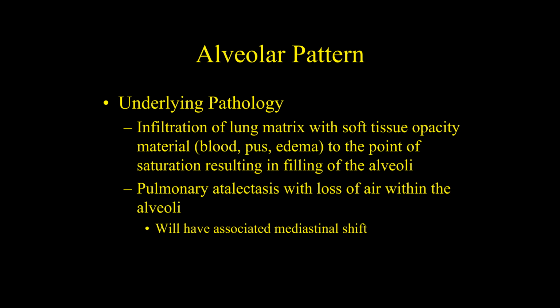So what are some parasitic diseases that can happen in the lung? Paragonimus, lung flukes, Strongylosis, and other weird parasitic diseases. The other thing is heartworm disease. Heartworm disease in dogs and cats can cause an allergic pneumonitis, which shows up as a bronchial pattern in the lung. So that's bronchial patterns.